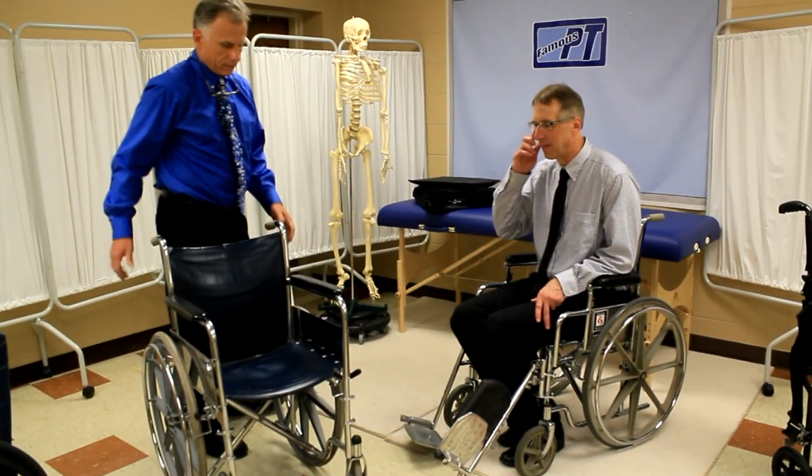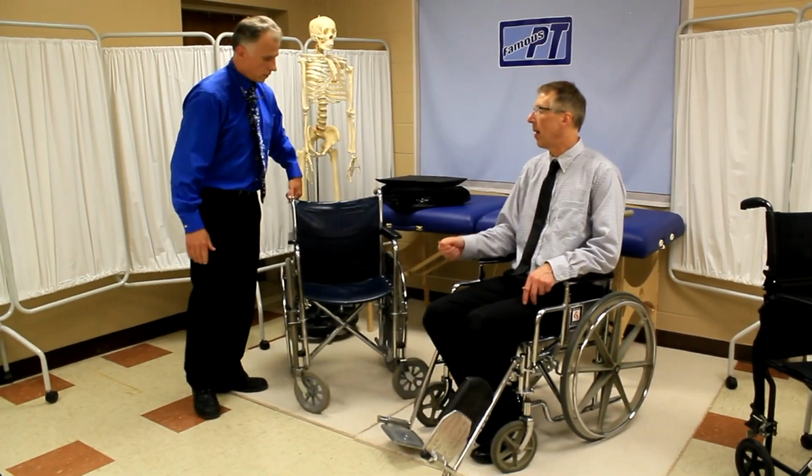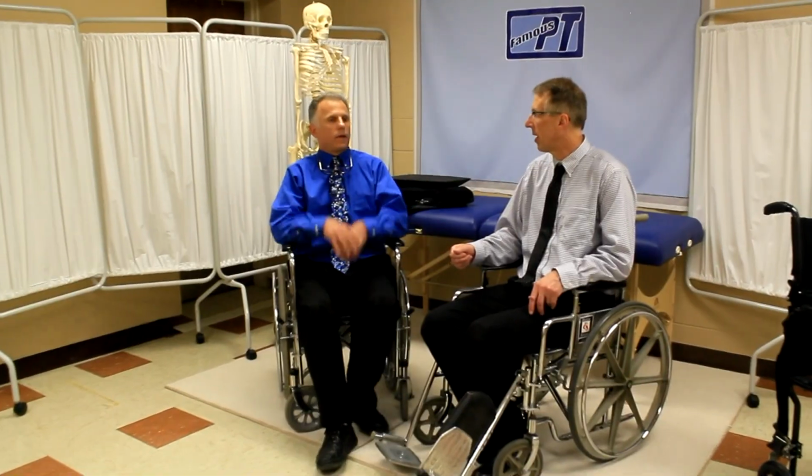All right, those are a lot of the features you can consider when buying a wheelchair. Sure. And we're going to do another video on height, how to adjust the height of the chair. How high should you be? Where should your footrest be?